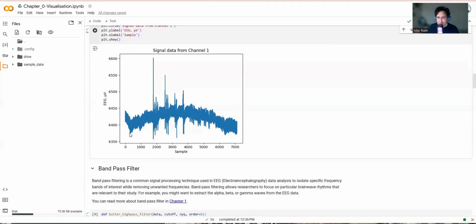These datasets are quite noisy, but it was done on purpose, because I wanted to receive a much noisier dataset, since in this case we can use our signal processing knowledge much more clearly. It's noisy because the connection was not so good, let's say mechanical, between the electrodes and the skin. It was not so forced, just slightly touching my head, let's say.